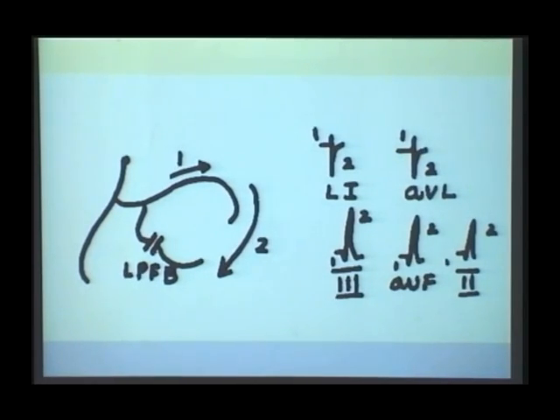So whatever has happened in superior leads has happened here in inferior leads. Whatever happened in inferior leads is happening in the superior leads here in posterior fascicular block. So that's why when you have these 3 leads showing a terminal positivity, L3 will show the tallest positivity, resulting in a right axis deviation of, what is the number? 120. Good. Right axis deviation, with the tallest R in L3.